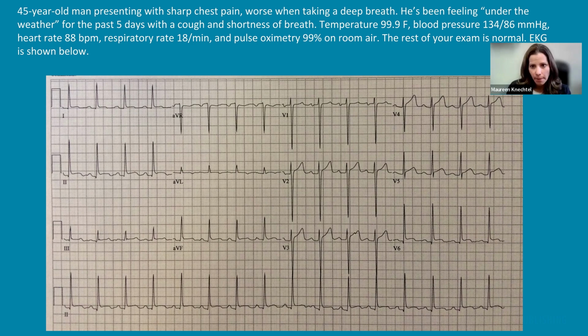Because if you have a STEMI, then you're going to have clear ST segment elevation in specific leads with ST segment depression in specific leads. And in this case, we just see this diffuse ST segment elevation in almost every lead. Because with pericarditis, we've got inflammation, irritation of the myocardium, the whole thing, not just one specific section. So that's why I wanted to put this case at the end, to really highlight, compare and contrast the STEMI versus other things that can cause ST segment elevation that we don't really get that excited about.